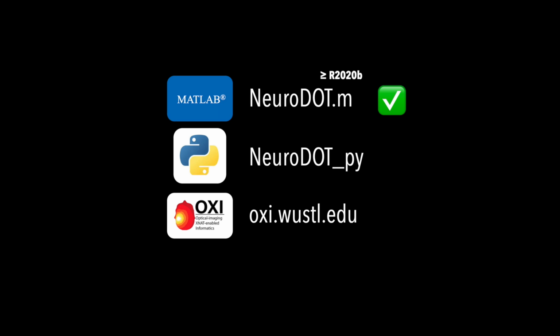Currently, only a MATLAB implementation of the app is available. A Python port, as well as tools for creating interactive slice renderings, will be added in a future release of NeuroDOT.